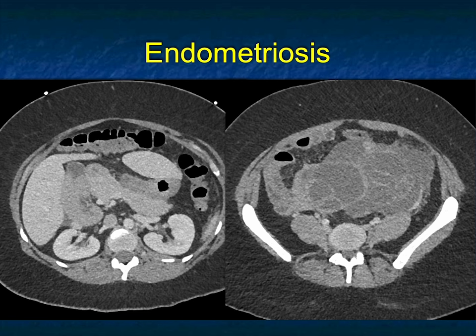At times, endometriosis, particularly if the patient is younger, but endometriosis occurs in the 40s, even 50s, can look just like ovarian carcinomatosis. It can have small cystic lesions, big cystic lesions, implants on ureter, implants on bowel, implants on the liver. And guess what? This was endometriosis. Just a really nice case.